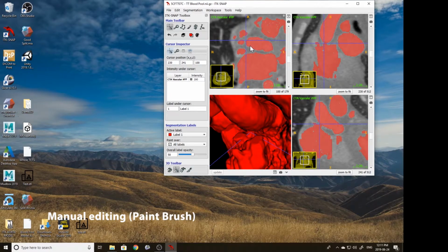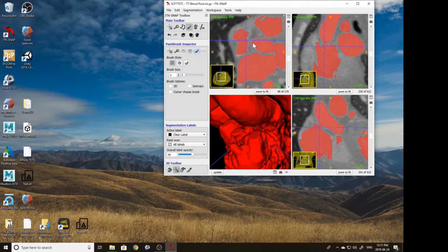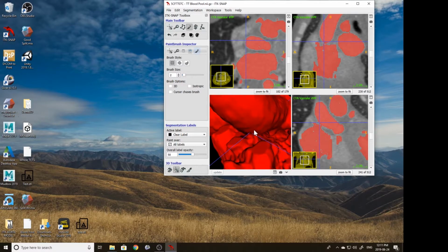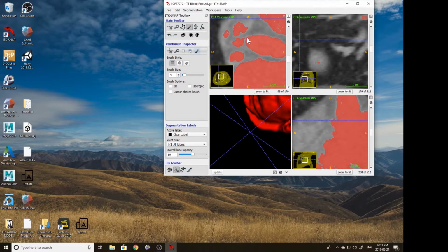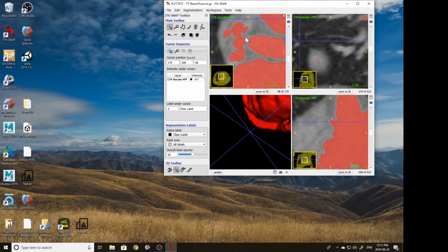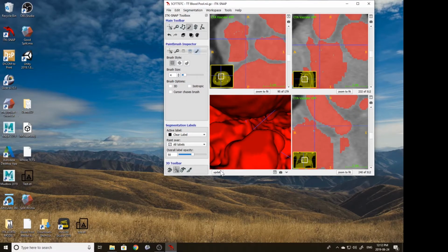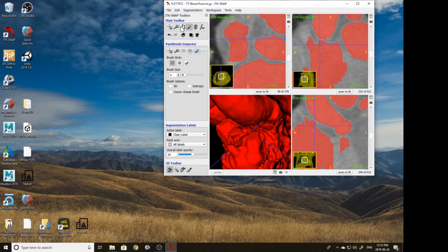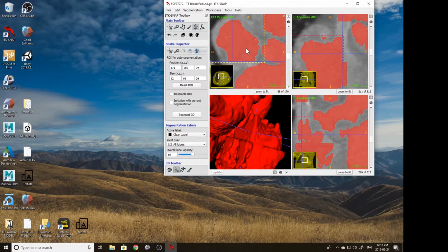I like that you can watch the crosshairs on the model or any of the views to kind of locate yourself on the other views. Again, just doing some drawing. Yeah, this is something that sometimes I will leave off to the very end. I'll make a note about all the places I'll have to do manual segmentation, and then I'll bring it over onto my tablet computer, and then I'll just do that all very quickly.